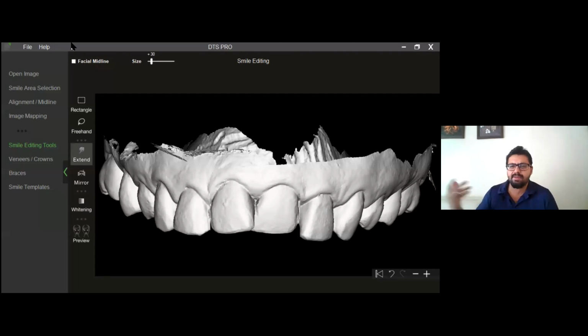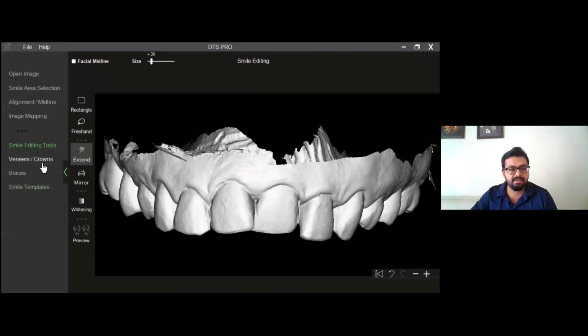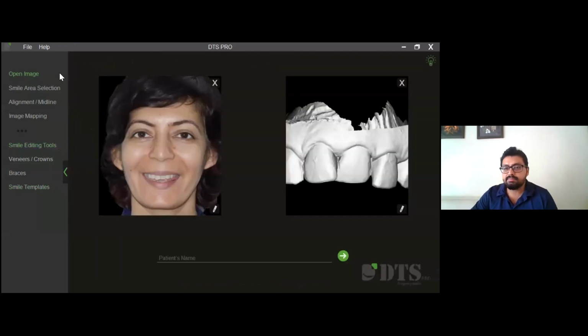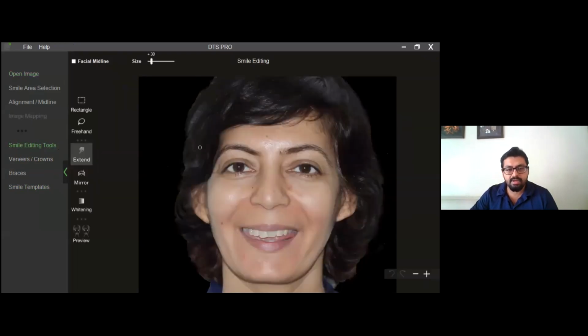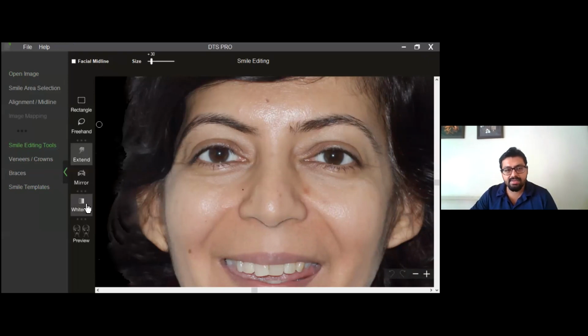It's a valid question, absolutely valid question. I answer this in two ways. A, whenever we do any sort of simulations, say for example, I'm just trying to upload, let me just quickly do any simulation for that matter. Right, so I maybe do a little bit of whitening for this lady and nothing else.